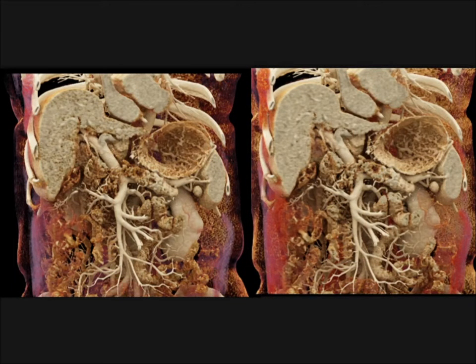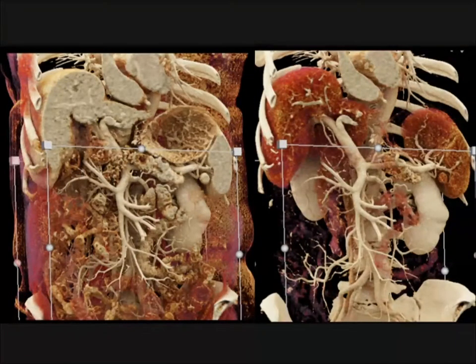So again, how we see things, and one more example of that. Think of the detail. So what if I accentuated that? Also, look at the patient's body of the pancreas tumor. You see that subtle tumor is very obvious now. And one of the things we've noticed is that with cinematic rendering, you're able to pick up subtle tumors by simply adjusting the parameters. And here's just one more set of images showing that as well.